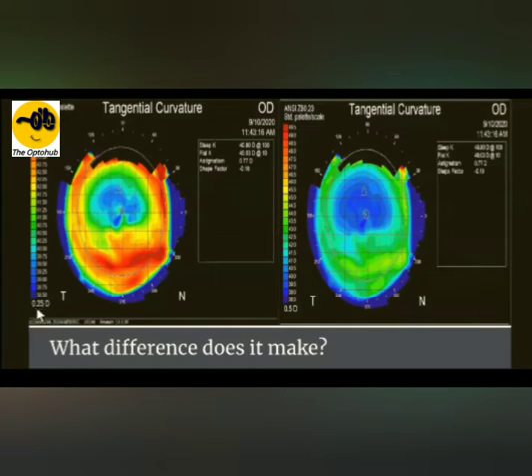Okay, this step height again you can change if you want, but if you choose auto scale, it will be calibrated according to this cornea. So on the left side, what you are seeing is auto scale, and over here it is 38.50, and the steepest is 44.00. So that means that this patient's cornea has a flattest region somewhere on the cornea of 38.50, and the steepest region on the whole cornea is 44 diopters.